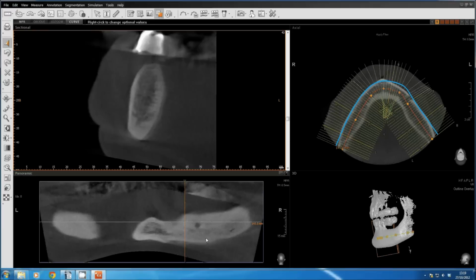Okay, so the first thing we need, and of course the mental nerve travels, or the inferior dental nerve travels from the lingual aspect, passes through the lingula on the lingual aspect of the mandible, coming forward on the lingual aspect, approximately the midpoint of the first molar. It then swings across the body of the mandible, travels more buccally until it exits out of the mental foramen.